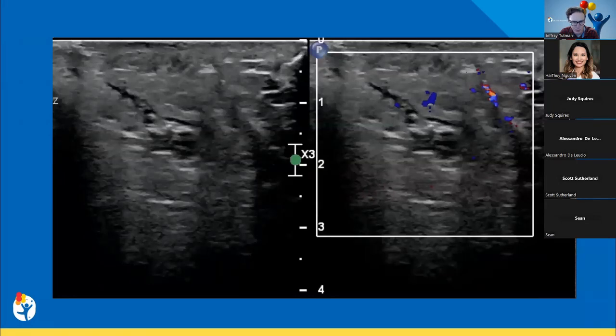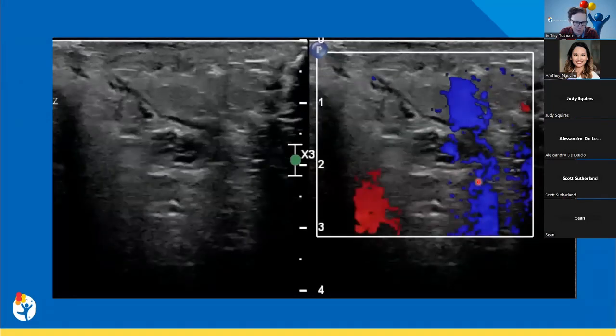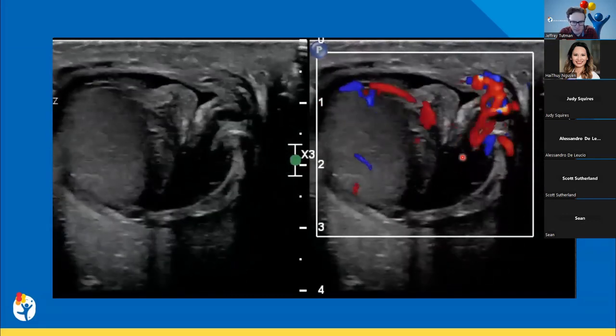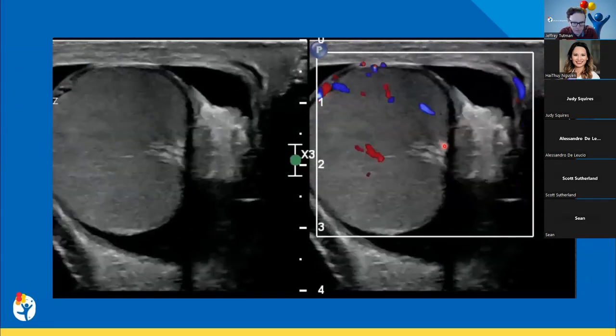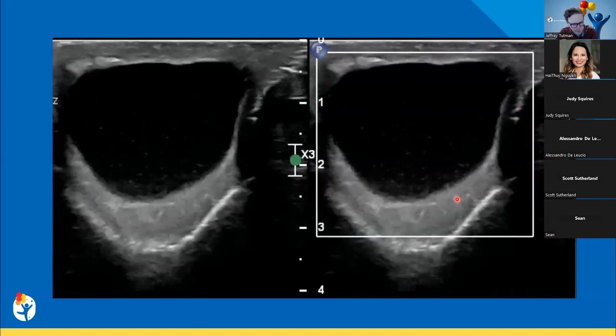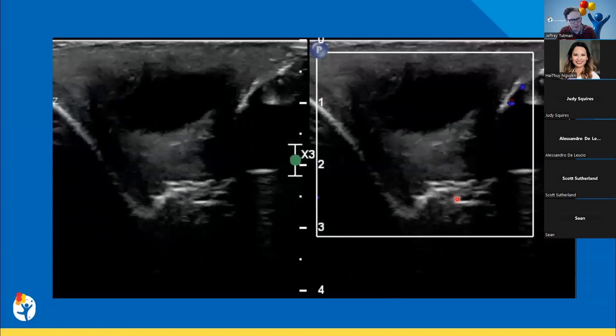He had a follow-up with urology, had a repeat ultrasound a couple weeks later. Again, showing you that transverse clip, very heterogeneous appearance of the epididymis still, but that twist in the cord is no longer present, has developed a little bit of a debris-containing hydrocele at this point.